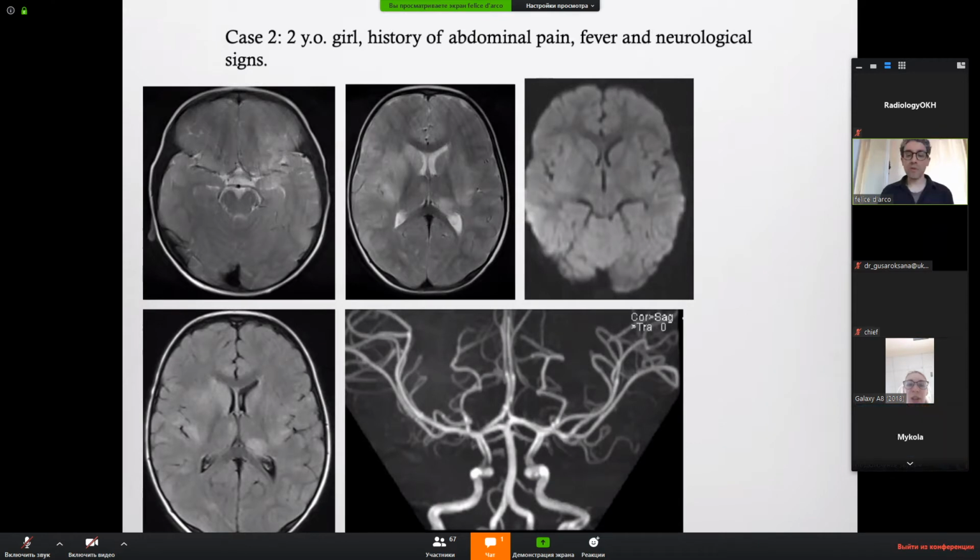One thing that is very important is that when you have symmetrical lesions in the basal ganglia, you think of a metabolic neurogenetic disorder like mitochondrial disorder, not only mitochondria, but this is the best example. When the lesions are bilateral but asymmetric, think more about infection, because of course this is not a genetic problem involving all the body. Anyway, in this case, I show you the MRA.